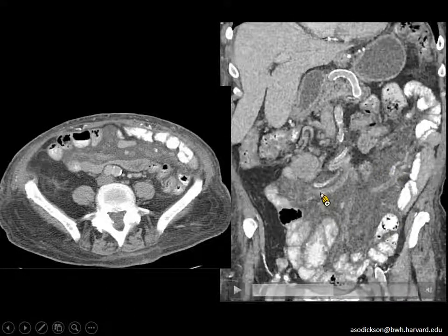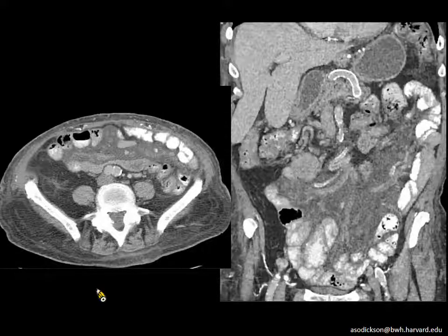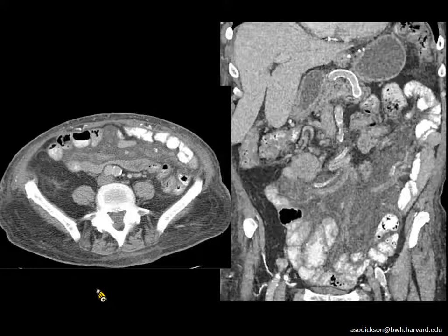We don't actually see bowel obstruction, right? We do not see distended small bowel loops here. But one of the very concerning things that can happen after bariatric surgery is we can have internal hernias. We have created holes in the mesentery that bowel can pass through, and we can have internal hernias that are a surgical emergency even without seeing obstruction of those small bowel loops.